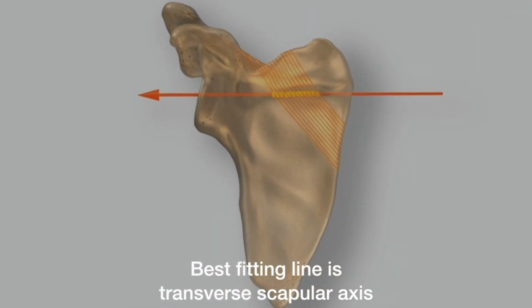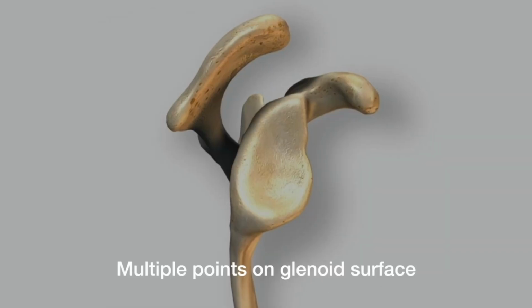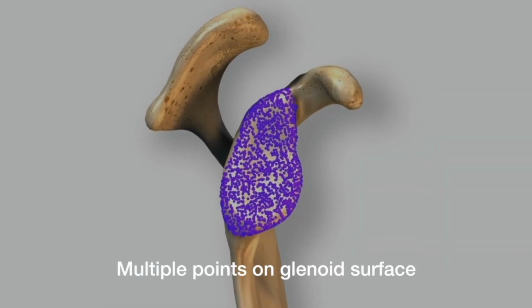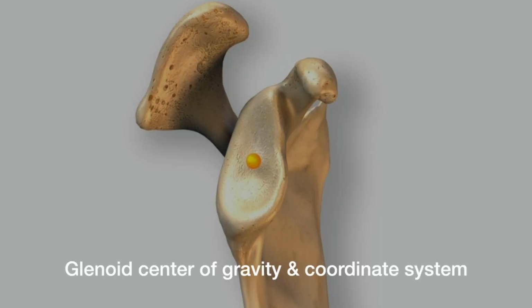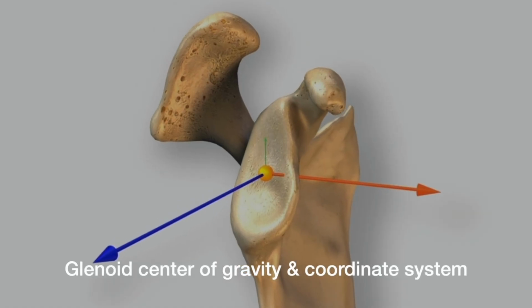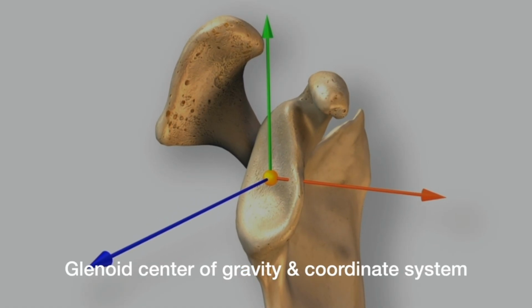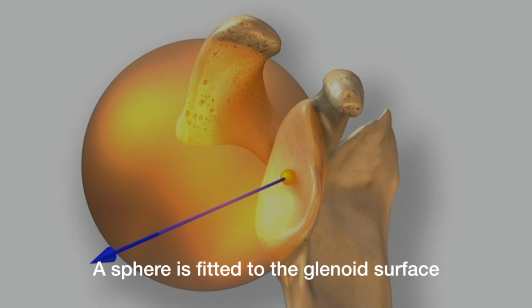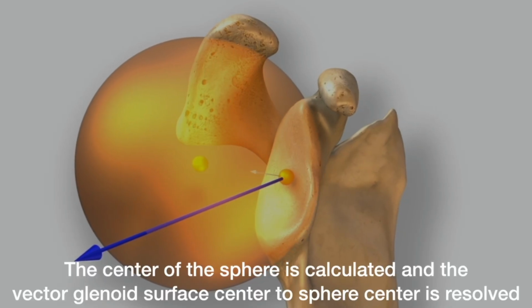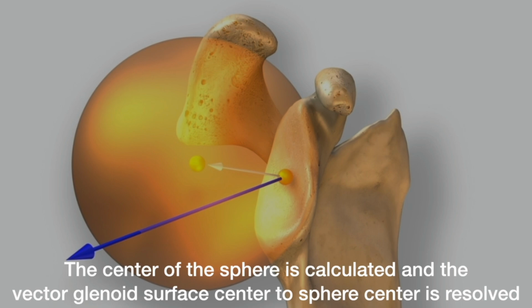And then we're going to place a number of points on the surface of the glenoid that will allow us to estimate the center of gravity. If we then allow BluePrint to place a best fitting sphere, that sphere will have a center itself, and the connection between the center of gravity of the glenoid and the center of the sphere is a vector that can then be used to estimate version and inclination.